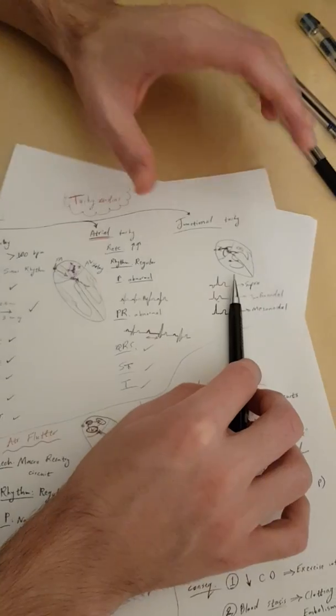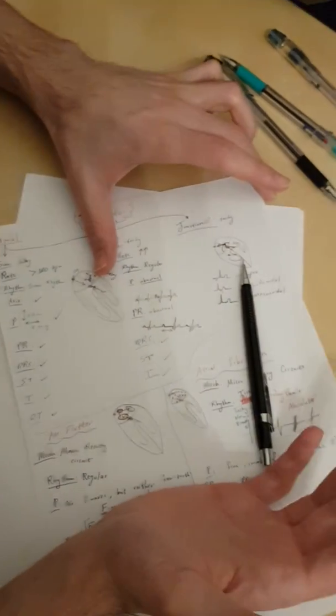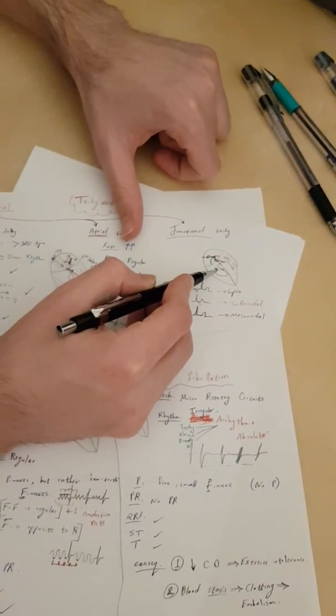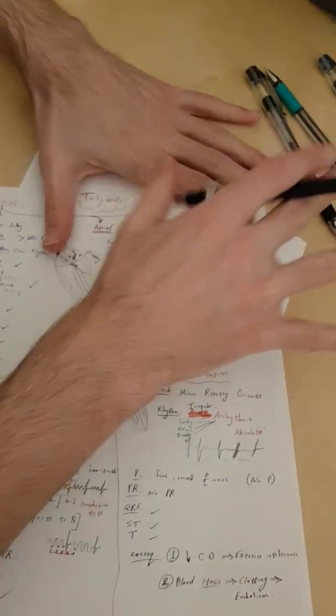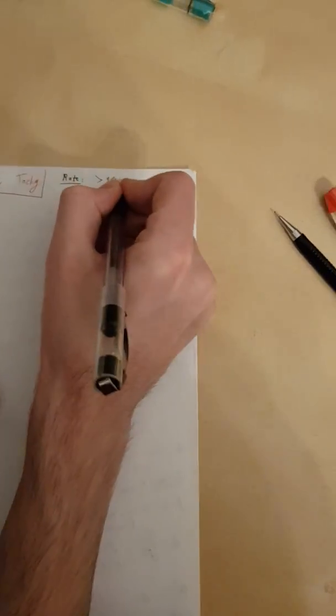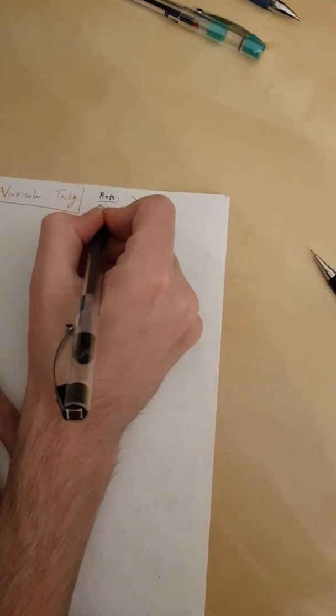Or they say that the other name for triplet is ventricular tachycardia, meaning when you have beats originating from the ventricle and then they go cell to cell and that's how they spread. This is a ventricular tachycardia when you have more than 3. So you will see an ECG that's just like these, just random stuff, okay? So what will the rate be? It says tachy, right? So obviously above 100 beats per minute. Rhythm.